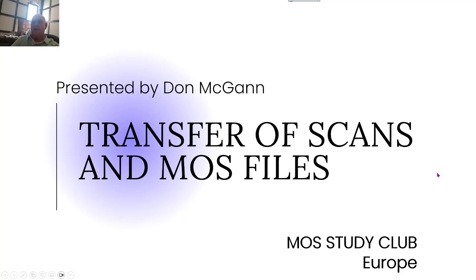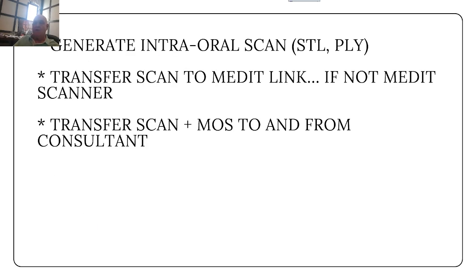Good morning. This is Don McGann, and I have put together a presentation for you that will explain the transfer of STL files, exporting, transferring into Medit MOS, Medit Orthodontic Suite, and also the transfer to consultants. This I found is just a common learning curve, and so hopefully this can help you get everything going quickly.